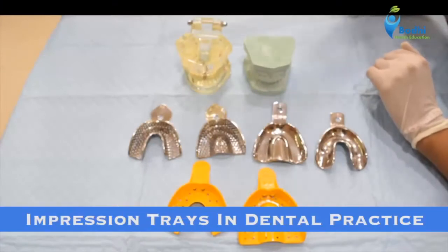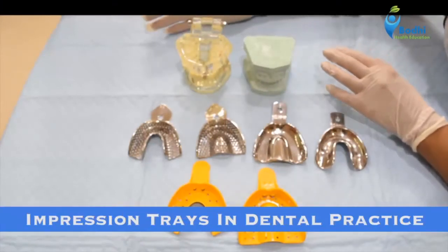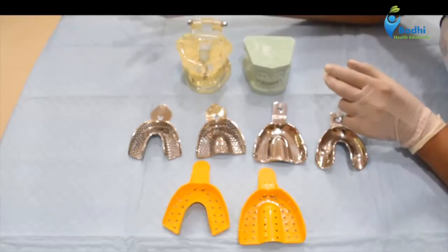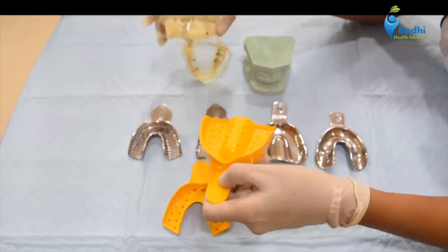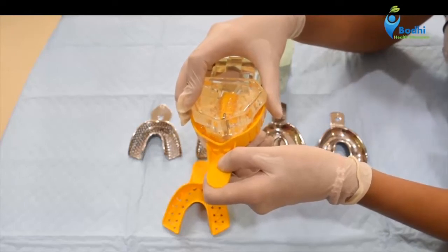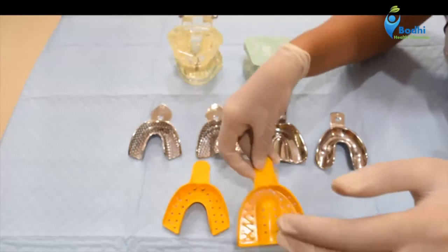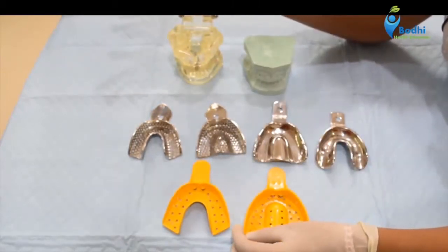Hello friends. So today I will tell you about the various impression trays which are used in the dental clinic. What is an impression tray? An impression tray is used to carry an impression material while making an impression in the patient's mouth. Impression trays can be used to carry various kinds of impression materials. I'm sure by now you know the various kinds of impression materials.